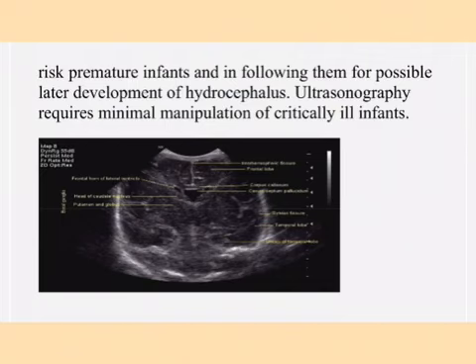Ultrasonography requires minimal manipulation of critically ill infants, so it's quite useful in infants. Right here is an ultrasonographic image of the head.